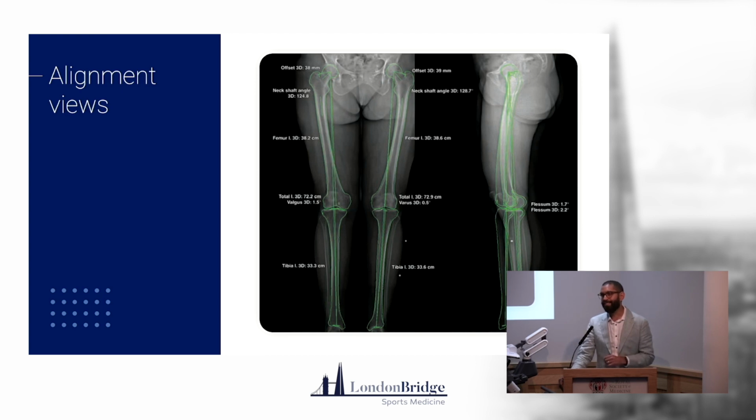We can always estimate Q angles clinically, so when you're looking at alignment of the hips and how much angular variation there is at the hip joint. Q angle is very useful, but if you want to do that properly or radiologically, you can use the neck shaft angle. So neck shaft angle is essentially a very descriptive way of looking at the angle between the neck and the shaft, and to give you an idea of what's happening and how that may interplay at the hip joint, but also at the knee joint. So very, very useful to get long leg views.